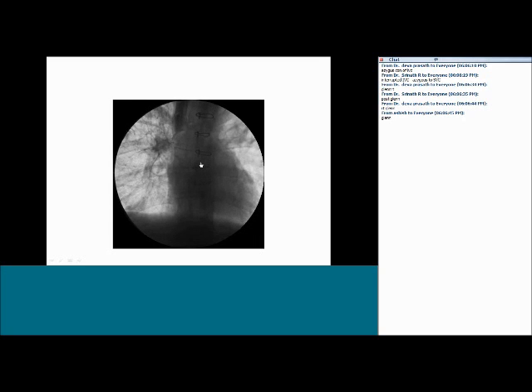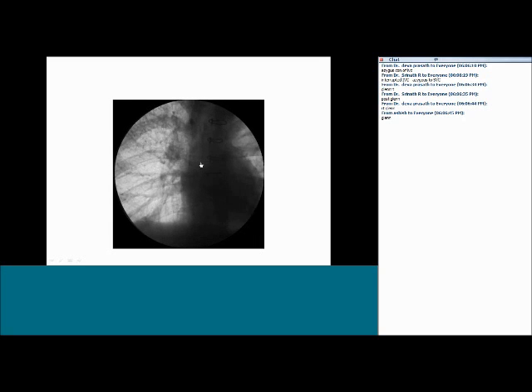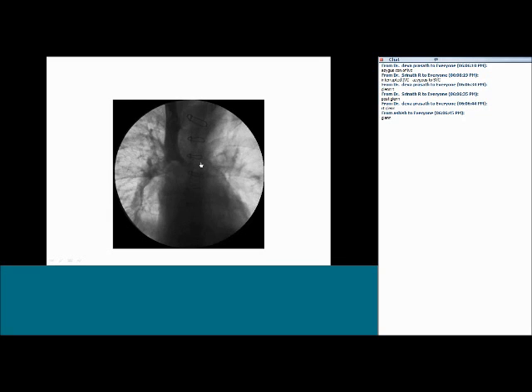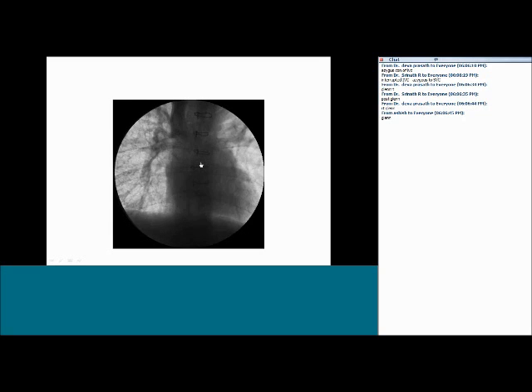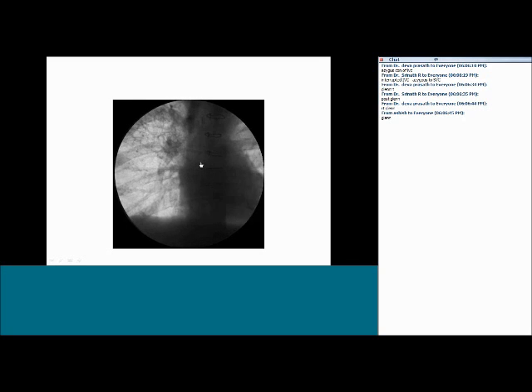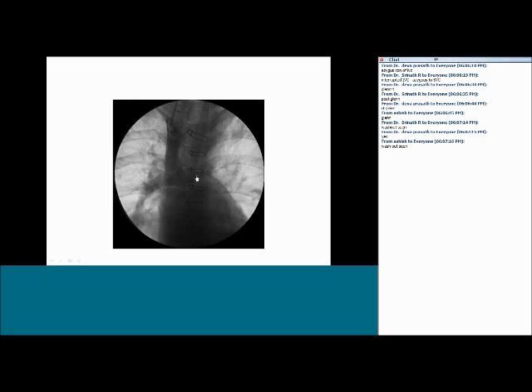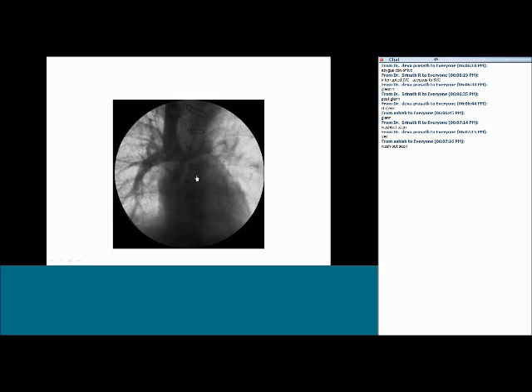Important point. Is there a forward flow? Does the right ventricle have a forward flow? I mean, whichever ventricle, single ventricle, has a forward flow or not? Can you see a negative washout in this region? Yes, that's exactly the right thing.